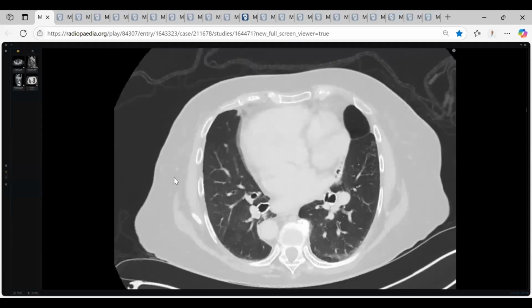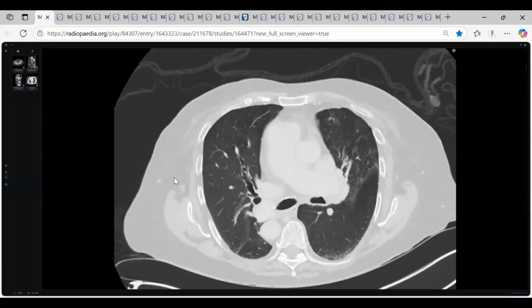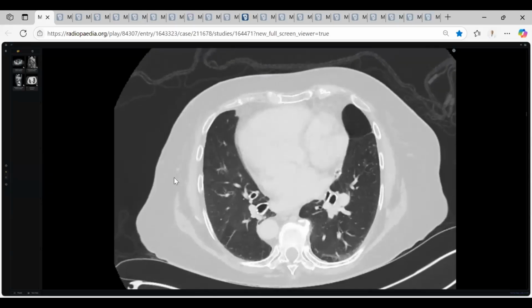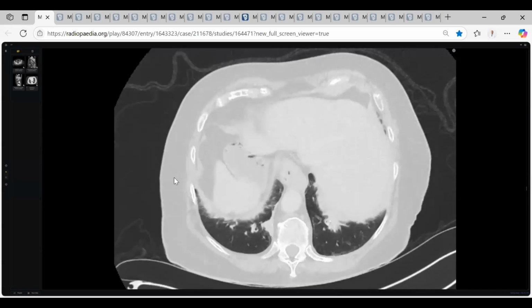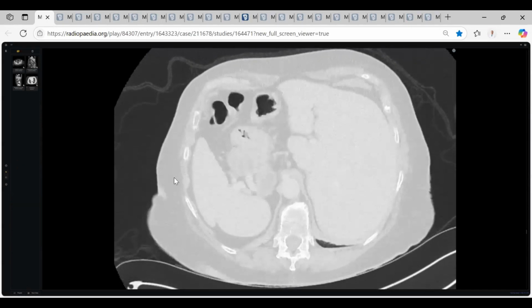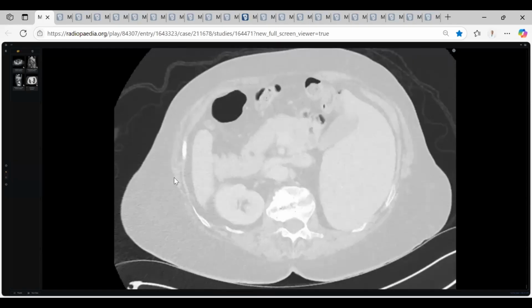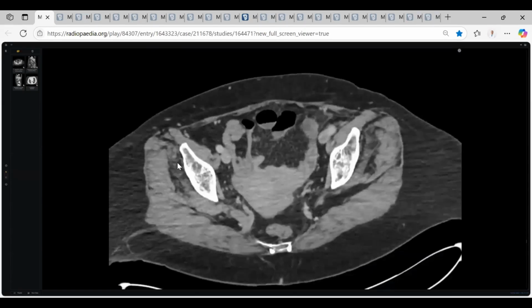Looking at the lungs, there's general emphysema, but looking at the bronchi in particular, there is mild calcification peripherally of the bronchioles and thickening. There's signet ring sign present as well. So there is lower lobe bronchiectasis in this patient. In summary, there is lower lobe bronchiectasis in keeping with situs inversus. I would also like to... Kartagener syndrome is a triad. I can't remember the other feature, sorry.